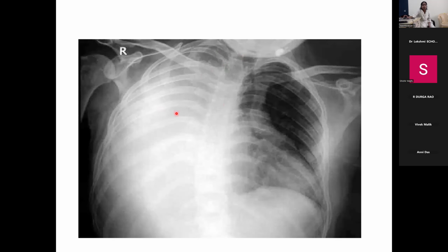When does it happen? When there is any intrabronchial lesion sitting on that side. At that time, there will be a large effusion, but the trachea will be shifted to the same side or not shifted at all. In those cases, you must have carcinoma or some intrabronchial tumor in your differentials.